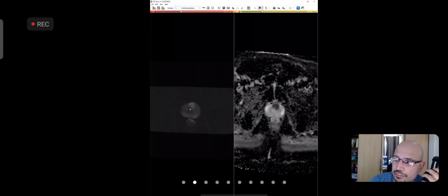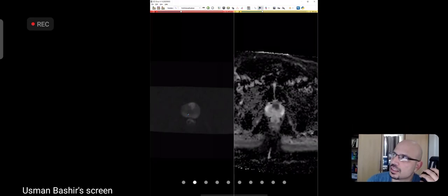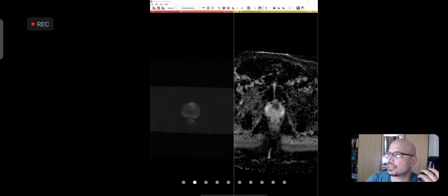Whereas when you look at the ADC map, this is bright and this is very dark. The ADC map is not derived from this one image. Sorry, I said it wrong. Let me show you the reason. Let's go through all of them.